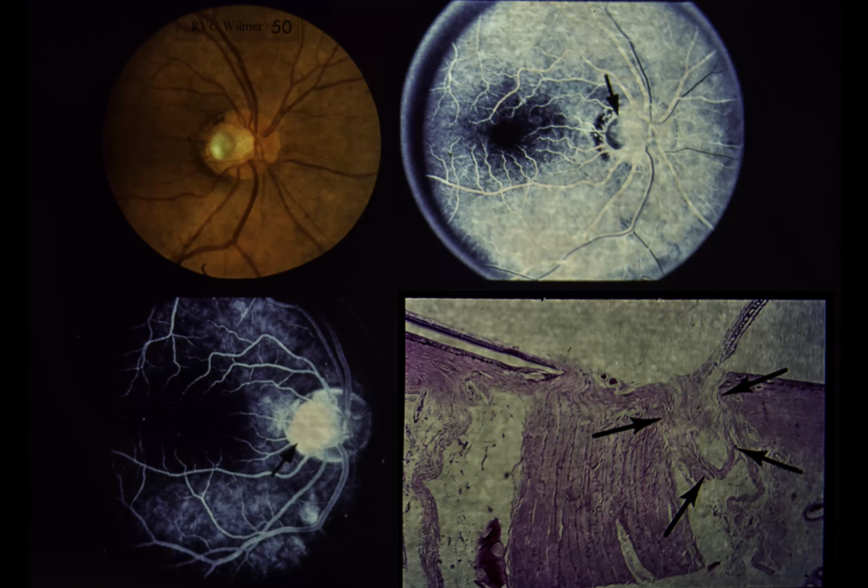Slide 50. Optic pit. This 41-year-old female was asymptomatic and had no history of visual acuity loss in either eye. The left eye was normal. The right eye had 20/25 acuity, normal color vision, and a small paracentral scotoma. Upper left. An oval, gray excavation is located at the mid-temporal aspect of the right optic disc. No vessels are seen in the concavity. The macula and retinal vessels are normal.